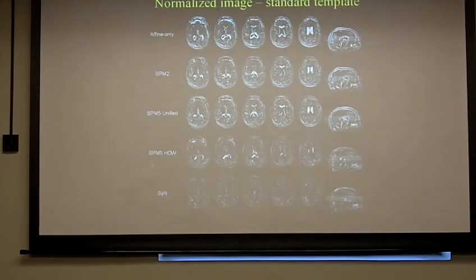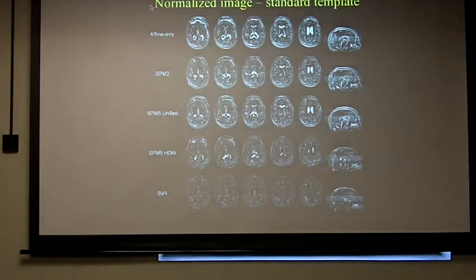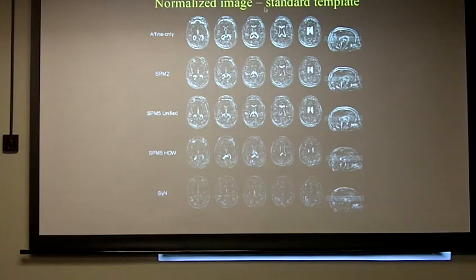So to illustrate this normalization efficiency between different algorithms, I subtracted the normalized standard template image from the normalized image, so basically this is an intensity difference.